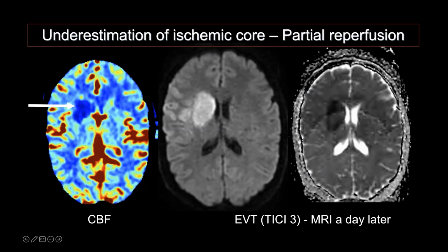What that means is this previous area where it did not pick it up. Remember, we said the only way it picks up is if the threshold meets that 30% criteria. But here, the non-contrast CT was already showing us that yes, there is already core that is setting in. So remember this phenomenon of partial reperfusion.